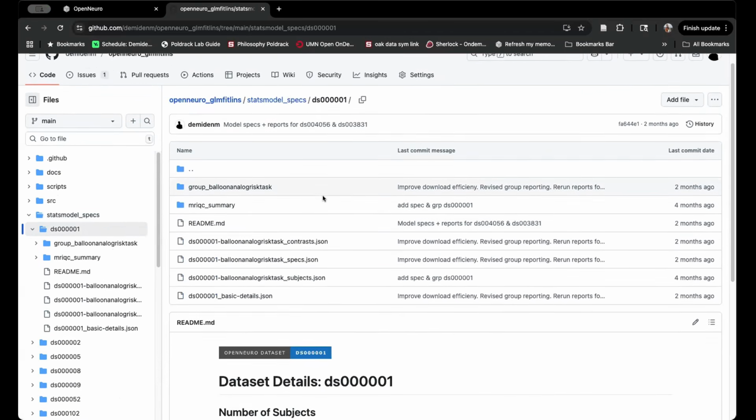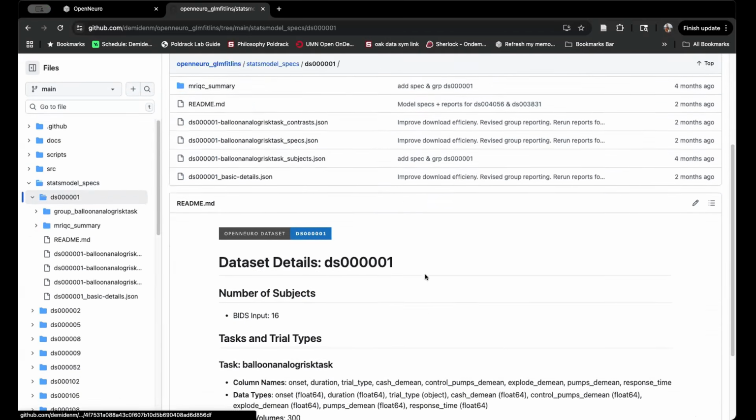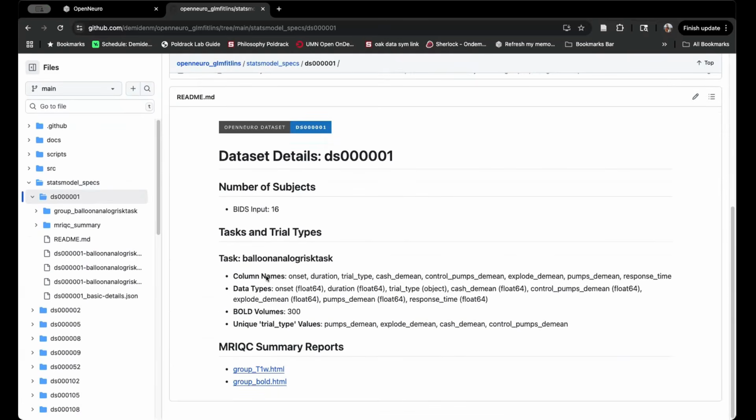And so when you run download, it creates this output. We just refactored something yesterday to add below each task how many subjects, how many runs per subject, and what the list counts of run types are. So some people will have 1, 2, 3, others will have 1, 2, 3, 4, 5.